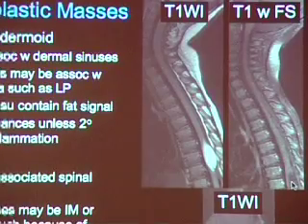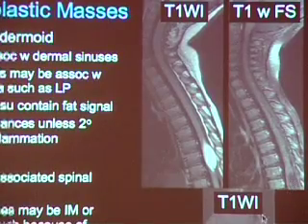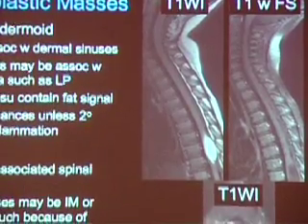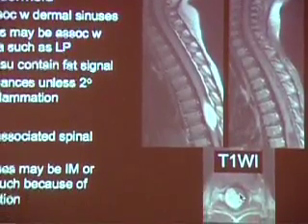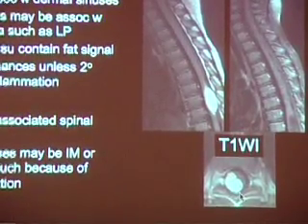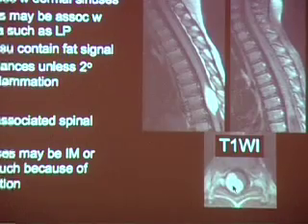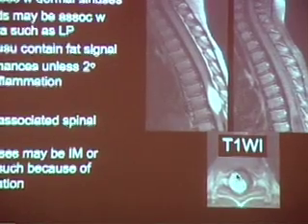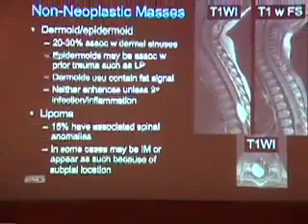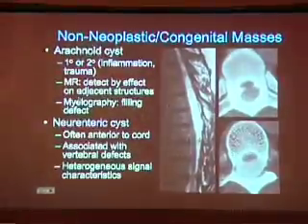So that confirms the fatty nature of this lesion. And when we look at the axial T1 weighted image, we can see how the cord is really being deviated and compressed, but at the time of surgery, this actually was in a subpial location, according to the neurosurgeon who decompressed this lesion. So this is a patient with a spinal lipoma presenting with progressive myelopathy.